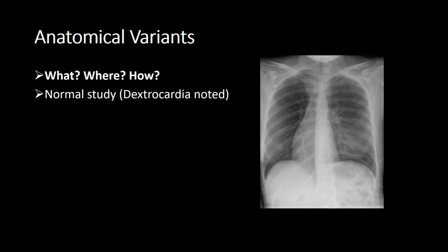So what, where and how? Normal study, dextrocardia noted.